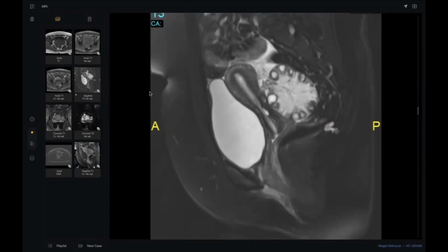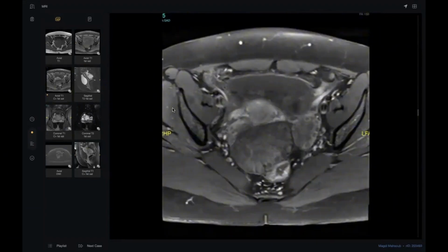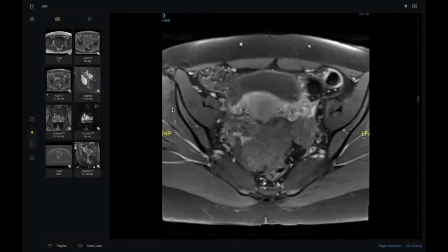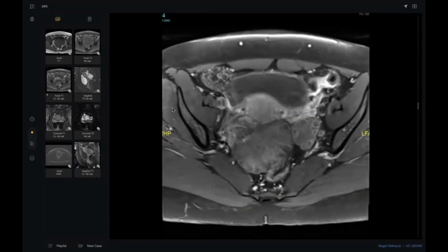So my principal diagnosis in this is likely a right ovarian torsion. However, I would like to see the cause of the ovarian torsion. STIR, yeah, a coronal may be better. Contrast enhanced coronal study. The uterus is somewhat pushed towards this lesion. Right over here, I'm suspecting some abnormality in the pedicle.